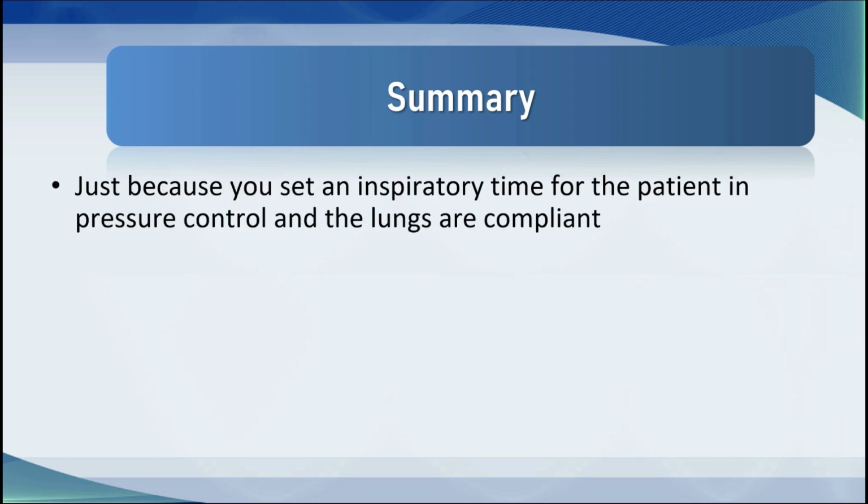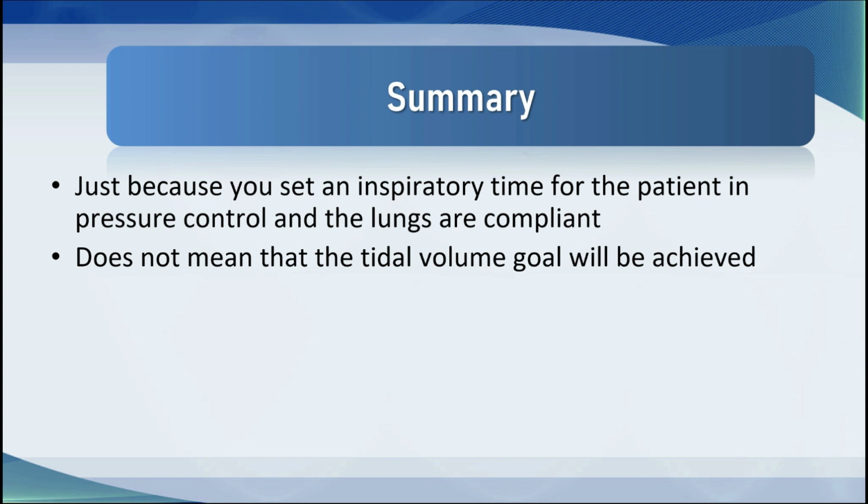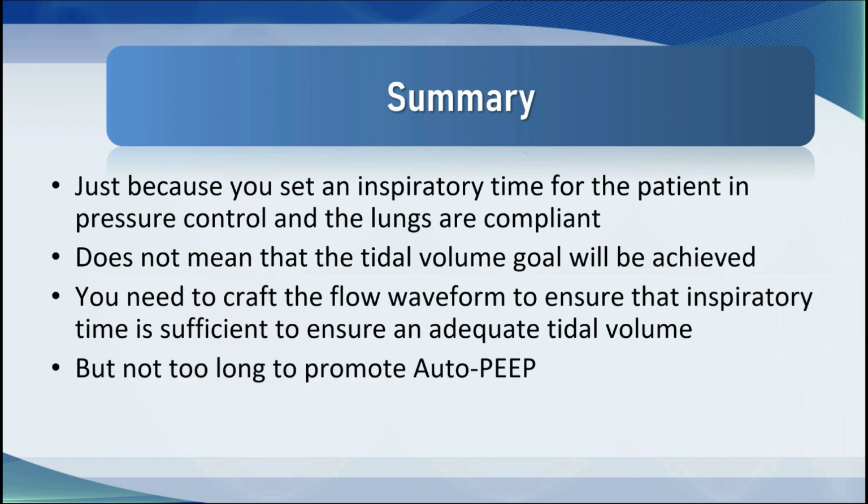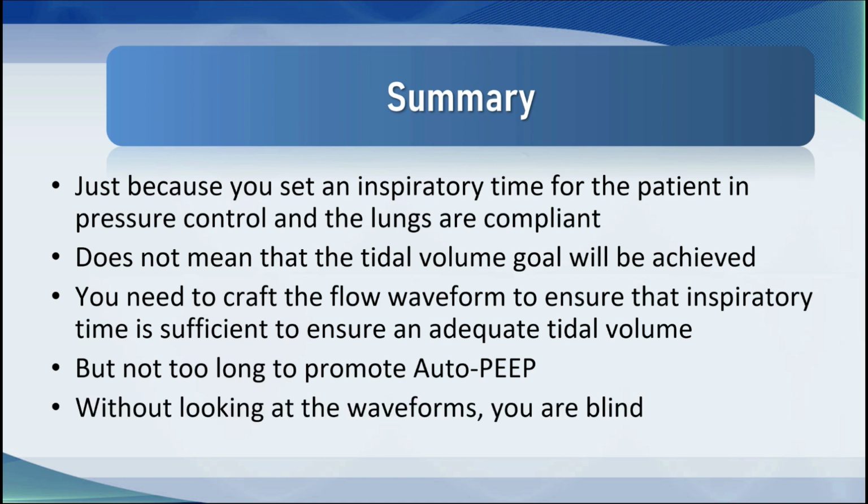Let's just summarize this part of the tutorial. Just because you set an inspiratory time for the patient in pressure control and the lungs are compliant does not mean that the tidal volume goal will be achieved. You need to craft the flow waveform to ensure that inspiratory time is sufficient to ensure adequate tidal ventilation, but not too long as to promote auto-peep. One thing that I've pointed out at every single stage of this series is the importance of looking at the waveforms on the ventilator. Without looking at the waveforms, you are blind.